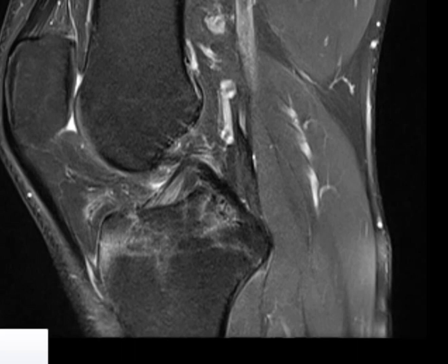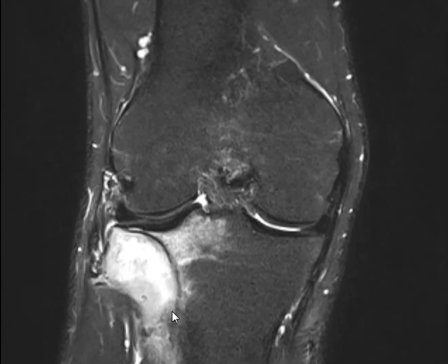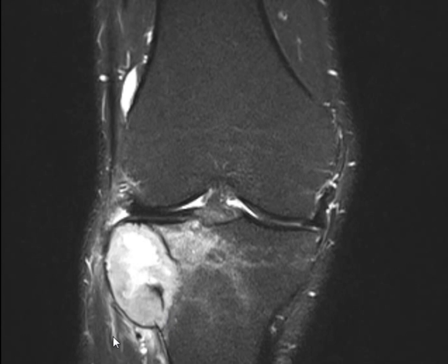Lipid containing lesion will appear what on T1? High in T1. Low in T2. High in T2 but a little bit less. So it's hyper on T1 and less hyper on T2. No, this is hypo in T2. Does it suppress on fat saturated image? So why do you see lipid content? It's enhancing. Now there is enhancement.